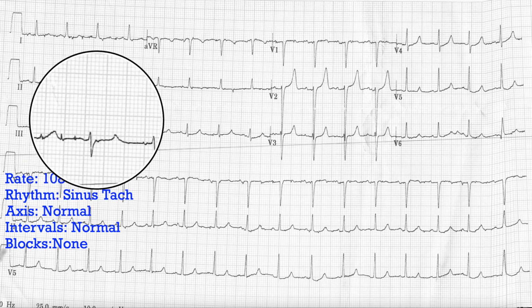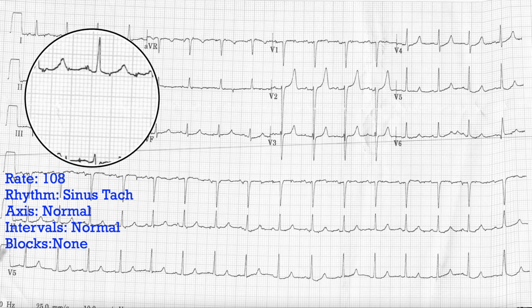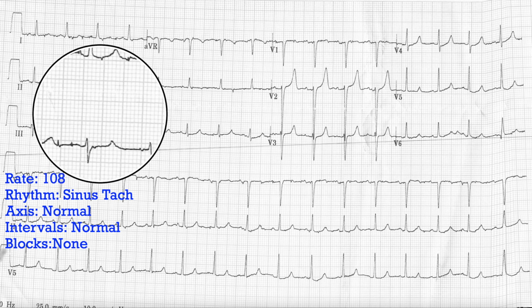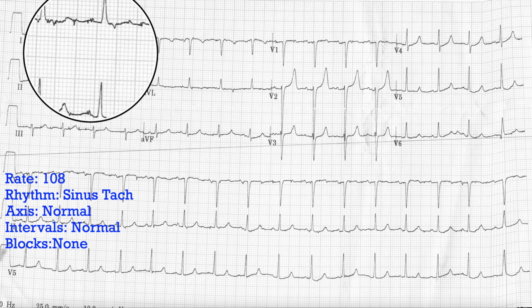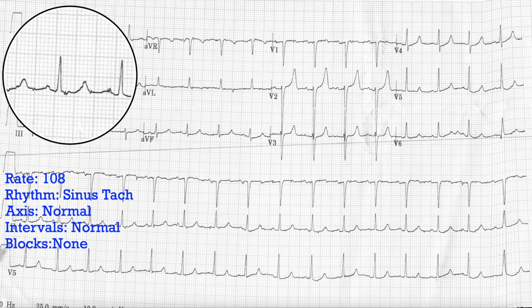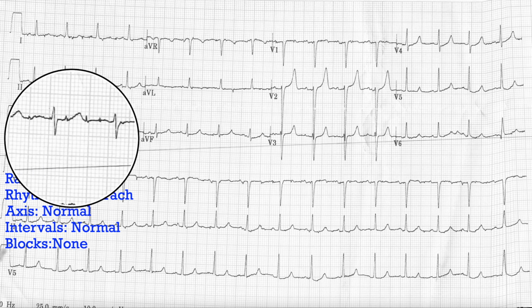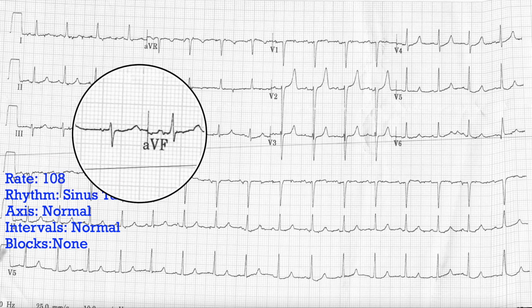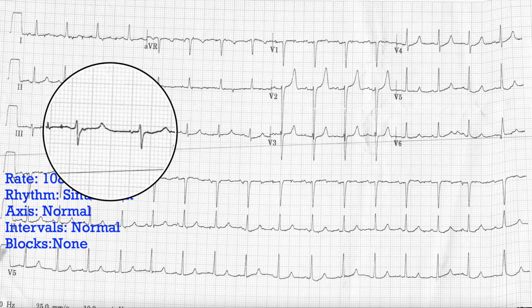When I'm handed an EKG, I first scan it to look for ST elevation, which is the big thing that everybody gets excited about, and then go back and look at the rest of it. When we scan through, I'll start up at lead 1 here. No ST elevation, looks like about the same. There are these little funky things going on here, by the way, that I think are just artifact. But no ST elevation there.